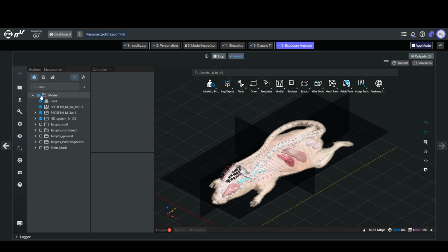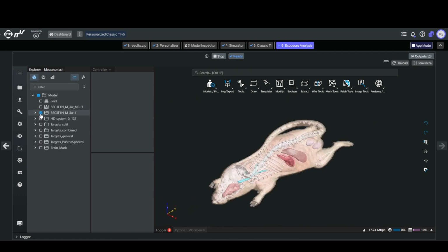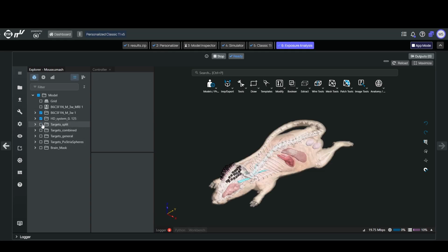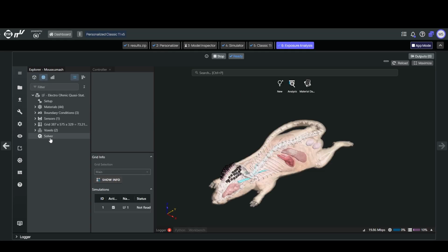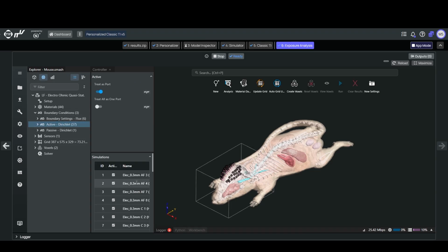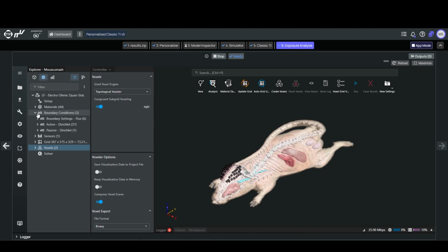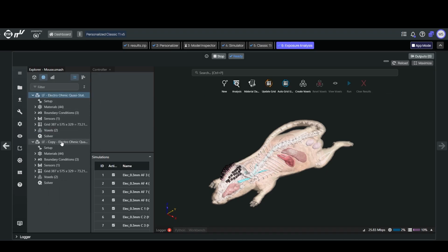Each template includes the full anatomical model, all standard targets and electrode positions, and a pre-configured multi-port simulation. You can use it to recreate all 61 lead field basis simulations, or as a starting point for investigating any specific montage in detail.